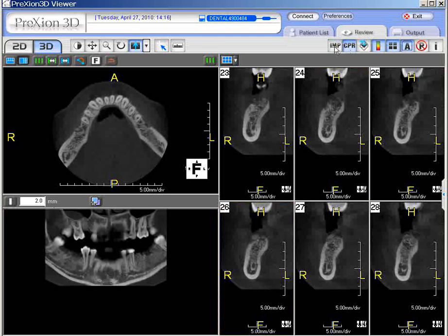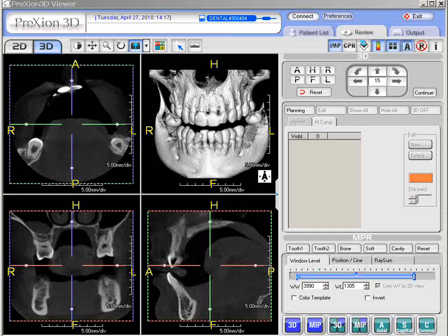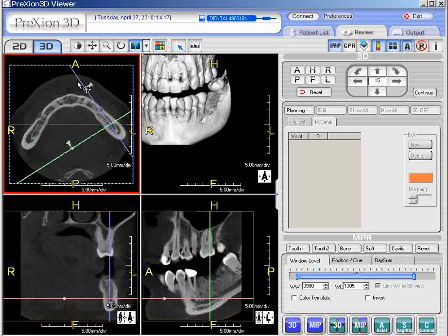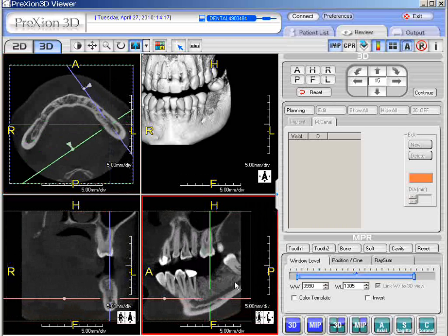So you could actually click this. Yes, and by clicking that, the implant function, you could pretty much use the Alt key. Let's take the left side here. Okay, so we can see the mandibular canal very nicely. I'm just going to hold the Alt key down, left click it right into the canal, and go back to the axial anchor point, grab it. So we get a nice, beautiful view here in the axial and coronal and sagittal screen.